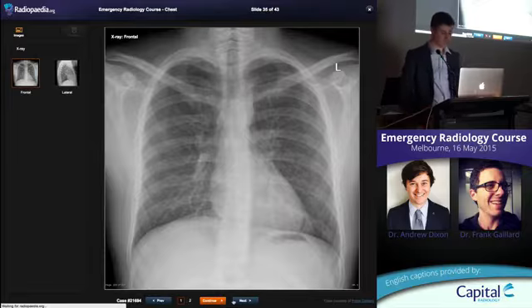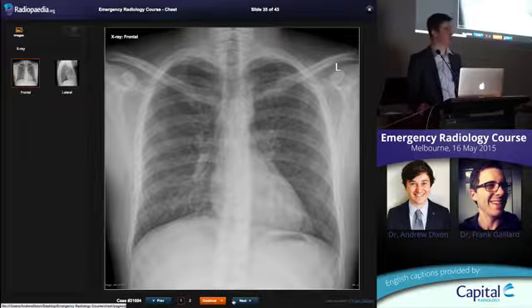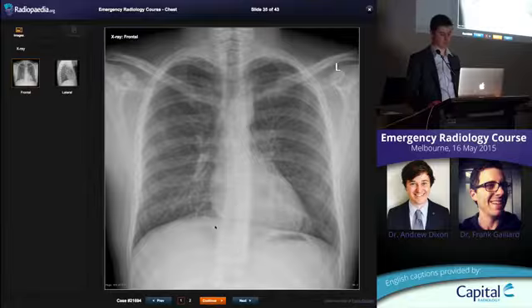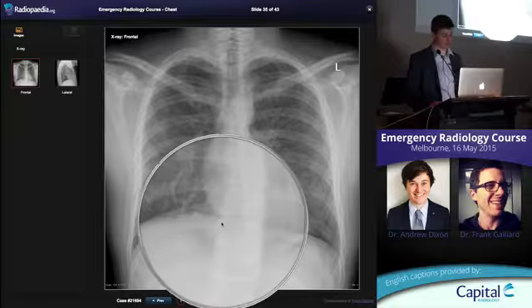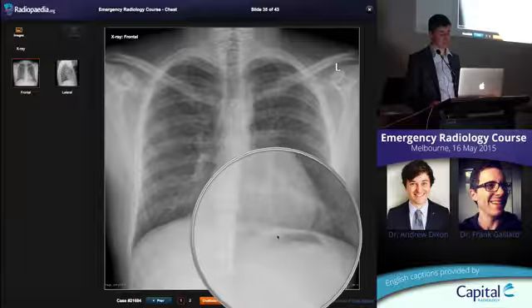All right. Now this is the kind of chest X-ray. There's a patient presenting with some shortness of breath and a bit of chest pain. This is the kind of chest X-ray that you often might call as normal because you might be missing some subtle findings. I spoke earlier about the hemidiaphragm and not being able to trace it across the midline when it touches the heart. This one you can probably start to trace it along there.